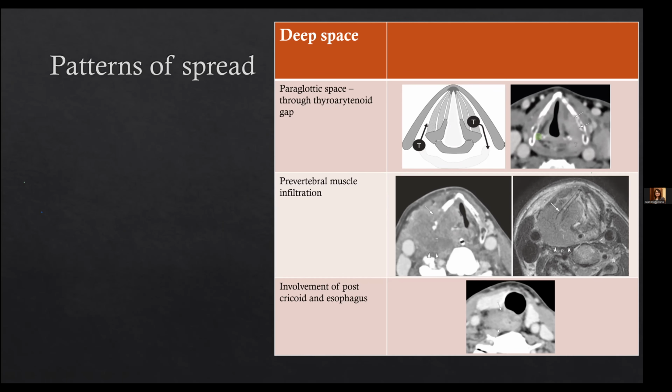So the tumor volume is basically calculated. Tumor volume is closely related to the final outcomes. I don't really remember the exact percentages, but how we calculate it is, we measure the tumor dimensions in three planes. Always in 3 planes only, that is the AP, transverse, and superior-inferior extent. Then we have a mathematical formula, that is A × B × C × 0.523. This is how we calculate the pre-treatment volume. Pre-treatment volumes, especially in laryngeal carcinomas, are extremely important, and therefore they should be given in most cases. I do not remember the exact prognosis in terms of percentages; my clinical colleagues might be able to help you.